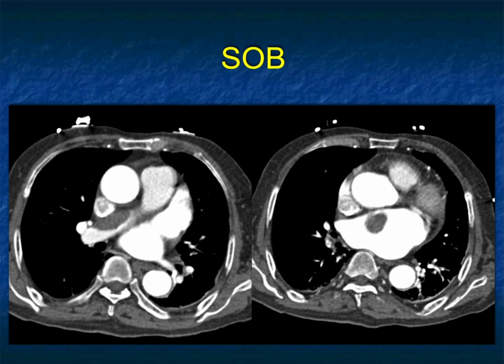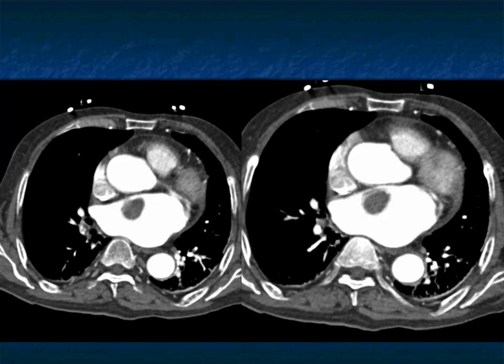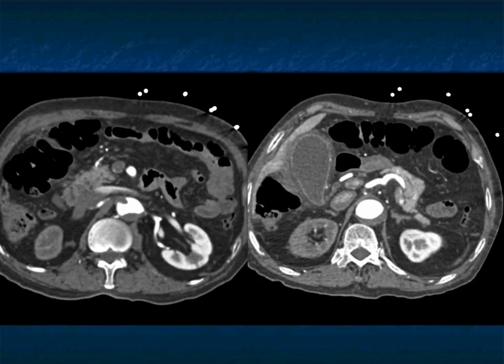Now, one of the other things we do see in terms of thrombi is patients with thrombi in multiple locations. Here's a patient with a large pulmonary embolism as well as a defect in the patient's atrial appendage. And yes, it is possible that you're dealing with an atrial myxoma and a PE. But when you see one thrombus, perhaps there's a second. And in this case, you see that there was showering of emboli.